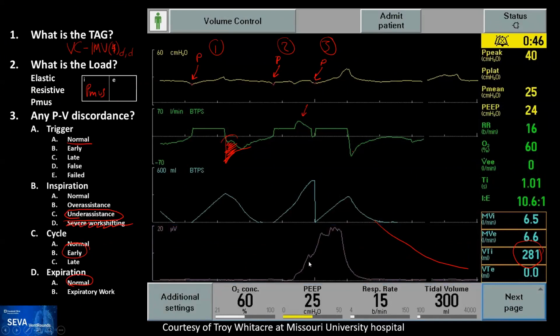Now, I'm going to show the waveform for the EDI, and this is what makes no sense, right? Because you have evidence of triggering with work shifting and no evidence of EDI. So absent EDI here tells you that something is off. It's either, and you have commented that it is other respiratory muscles triggering, but you have evidence of work shifting.